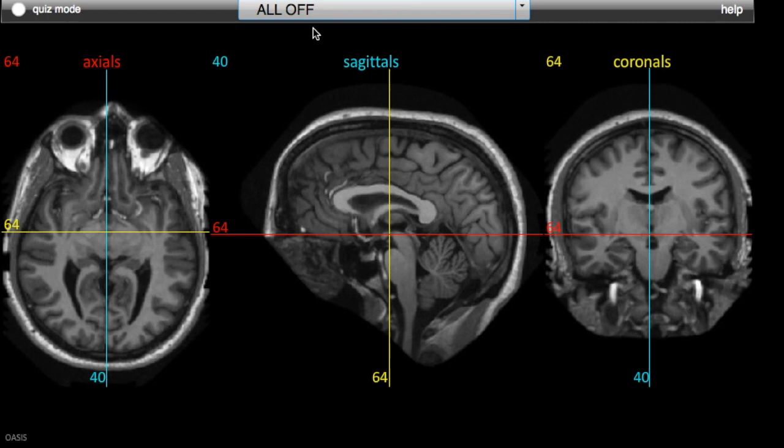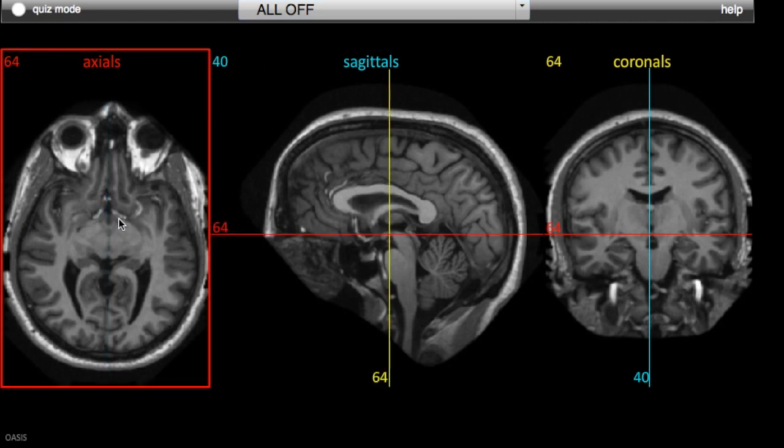And to do this, we're going to use a website that has an interactive module. It's a full MRI in all axes, starting with axial or transverse sections, which are on the left. These are the most high yield because these slices will show the most number of structures. These are the ones we're going to be focusing on today, and I'll cover the rest in further modules.